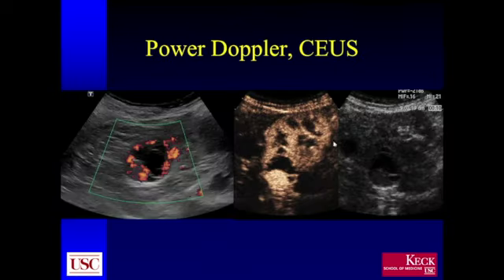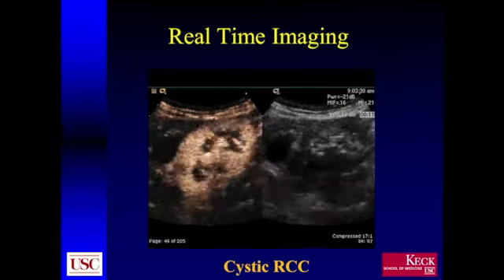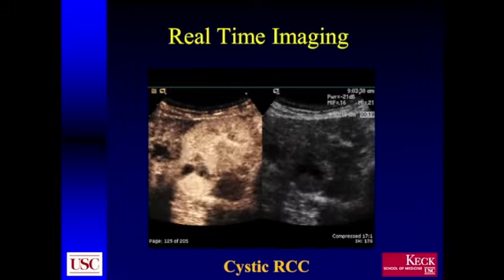On the contrast ultrasound, I think you can very nicely see here is the normal parenchyma. This is obviously early in the nephrographic phase. You can see the pyramids are standing out. There is that cystic area that was seen on the MR, but importantly, on the edge of this mass, you can see there is a solid structure, which is, again, hypervascular to the surrounding renal parenchyma and clearly suspicious for a renal cell carcinoma. This was a cystic renal cell here on the clip.